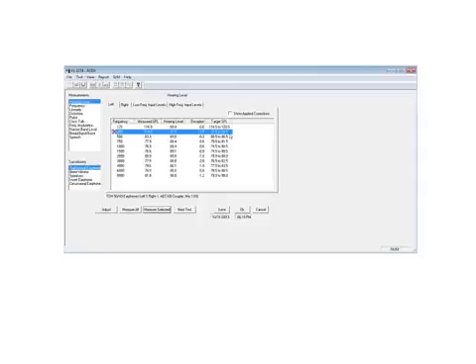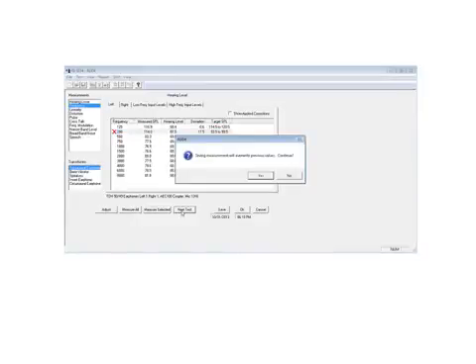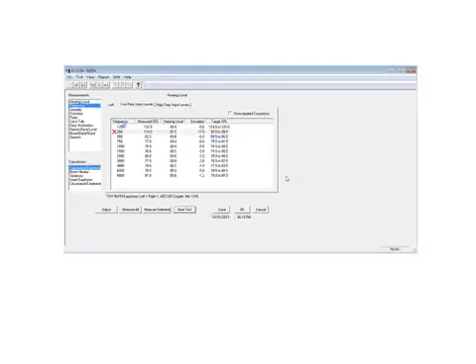In this case, the calibrator is over the microphone, which is telling me that the calibrator and the microphone and equipment connection is good, as I'm coming in with the 114 dB level for troubleshooting. We can go down to next test. It prompts me to save some data, and I'm telling it, no, I don't care to save this data.